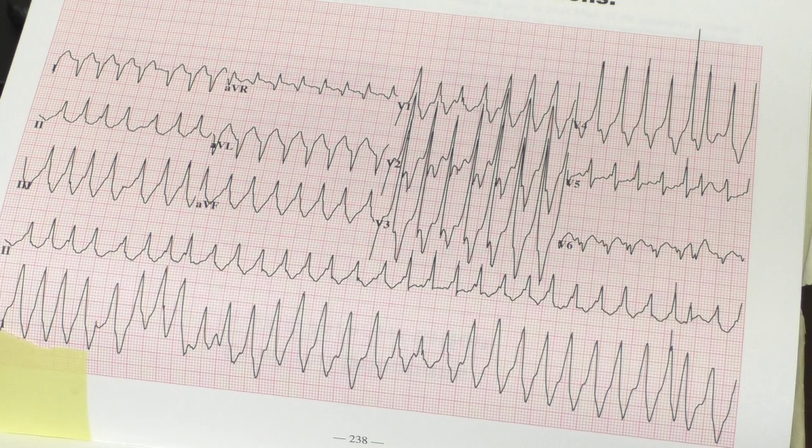Well, this is not reentry. There's no reentry. This is the atrium fibrillating. You have 2 pathways, one going down the AV node, and one going down the Kent bundle. So you're preferentially going down the Kent bundle. So instead of having a rate of 180, you'll have a rate of 300 or whatever, because you block the AV node. Do you give procainamide and stuff? Okay. Procainamide, yeah.